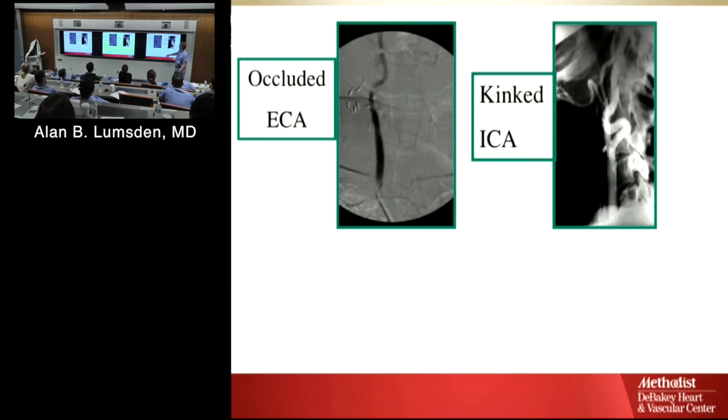Okay, you can see the silhouette. What kind of study is this? What's different between these two things? They're both angiograms. Yeah, no, this is called a digital subtraction angiogram. It pulls out all the soft tissue and bony landmarks, and leaves them in silhouette in the background. There's his jaw.